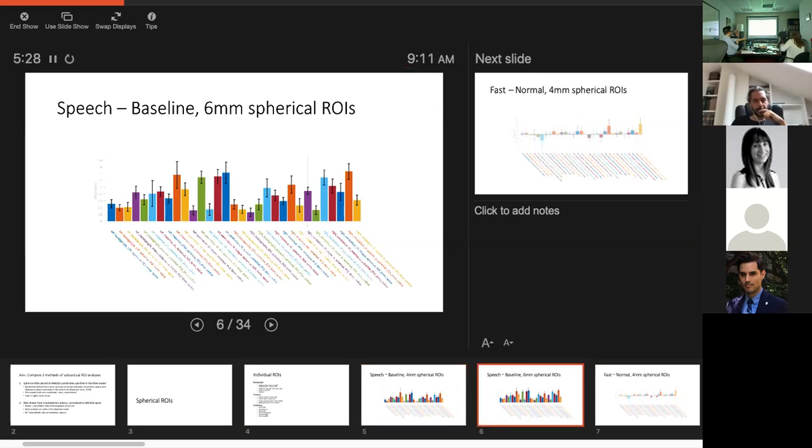Hey, Elaine. Were these run on unsmoothed data or smoothed data? So this was all unsmoothed data. I went back and ran another processing. Maybe it was at the first level. Yeah, it was at the first level. I set the smoothing to 0. So there's a separate first-level analysis, and then I ran this on that.